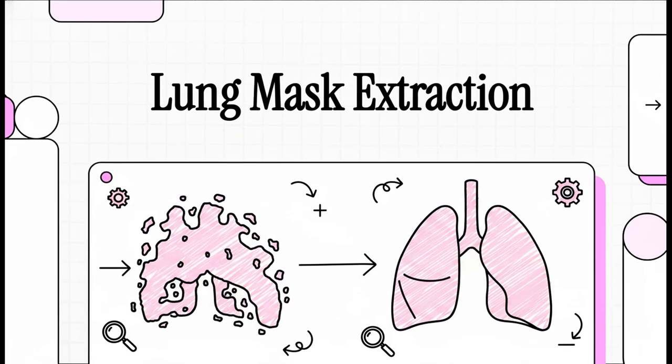So you've got a computer to highlight something in an image. Awesome. But the result is, well, a total mess. How do you turn that noisy, raw computer-generated mask into something clean, precise, and actually usable? Today, we're diving into exactly that, a fundamental skill in medical imaging.